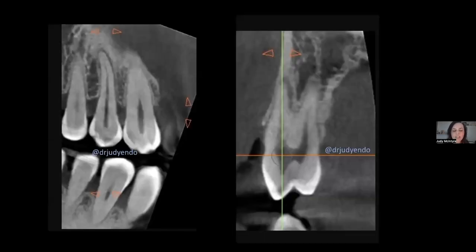Sure enough, when we took the scan, and remember, this is a virgin tooth, so very incredulous, right? Canine, horizontal, it dips. So I would call that a small angular defect. And then on the distal, the bone should go like here. So this is a bigger angular defect than the mesial.